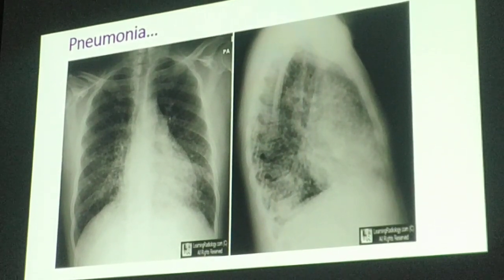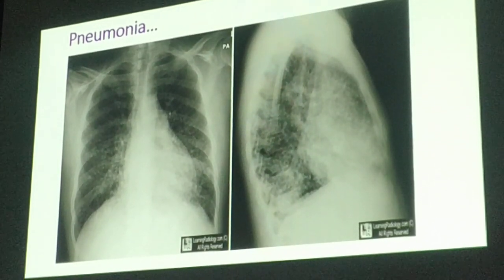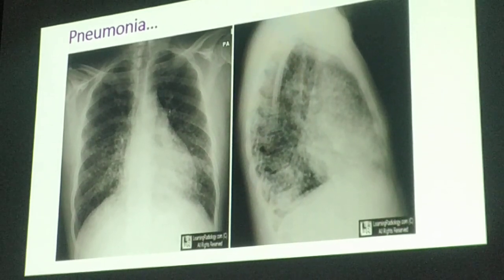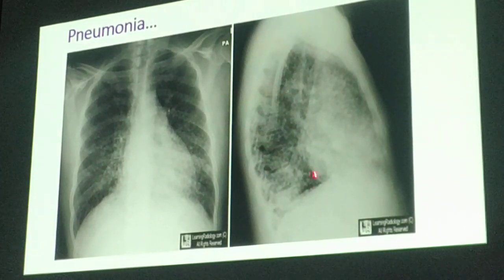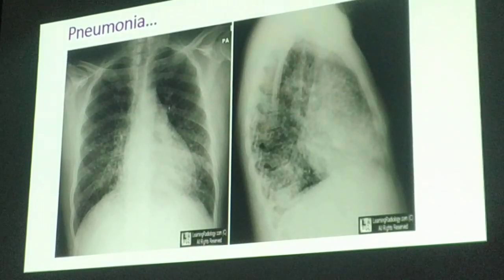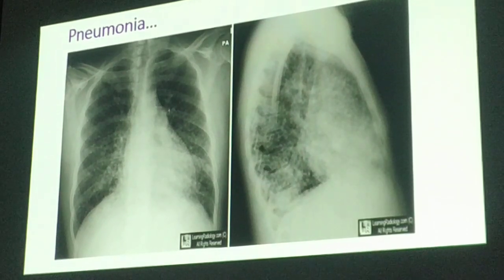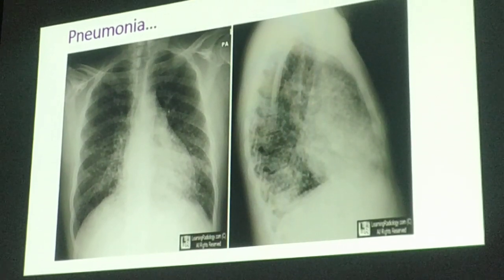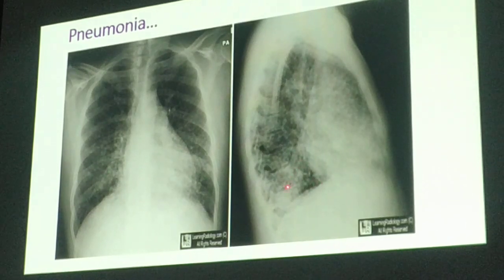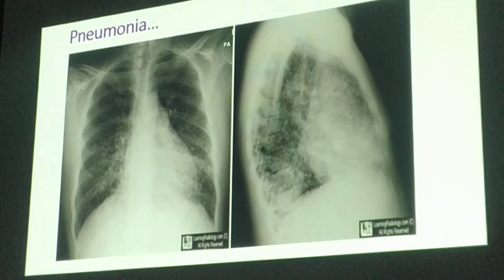So, what case is this? Pediatrics, adult? Pediatrics. Okay? In pediatrics, sometimes, this is what we depend on. Although in here you see the infiltrates, both sides have them. But what is significant here is that it is also present here. This is what we call the retrocardiac space. Haziness on both bases and at the retrocardiac space. Heart and other chest structures are unremarkable. Impression: pneumonia, bases. Okay?